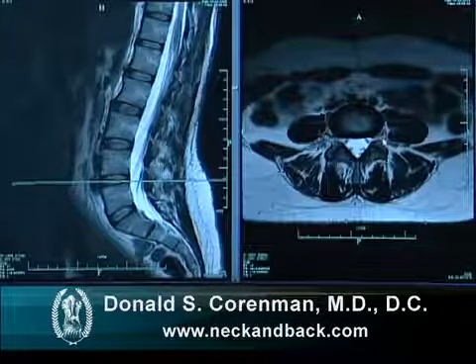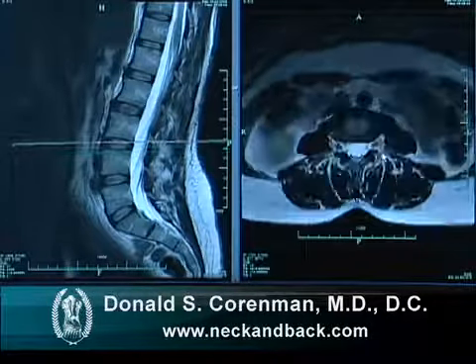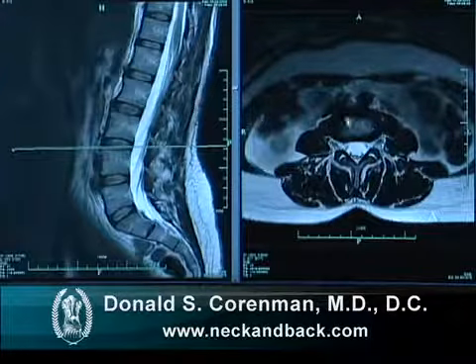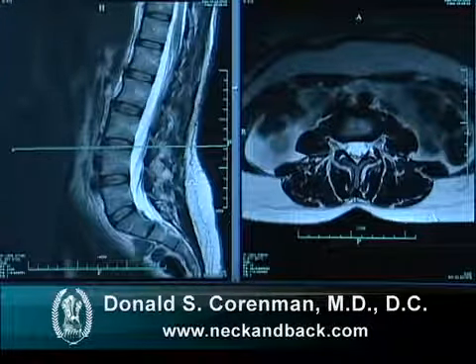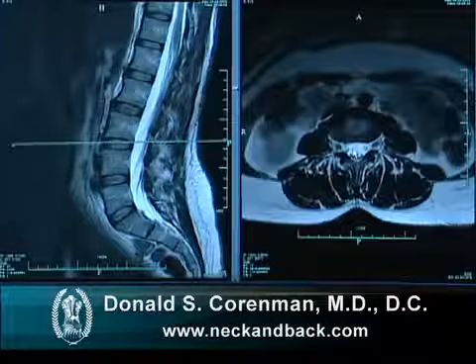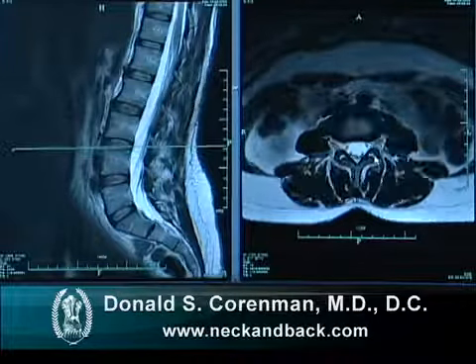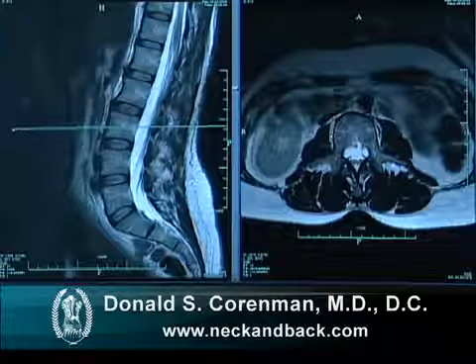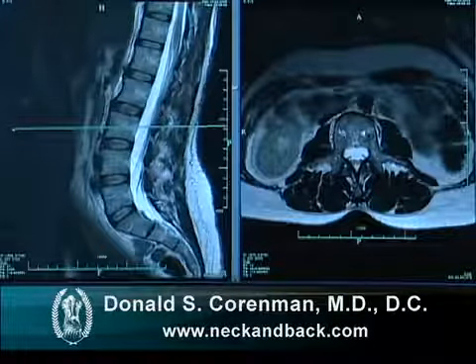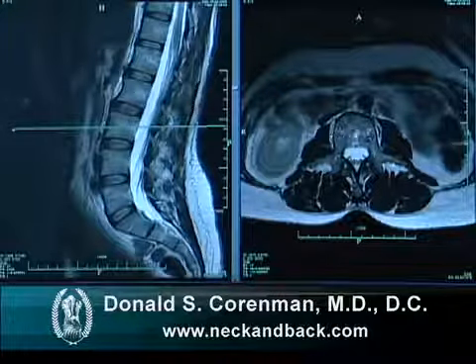These are normal facets. We can march up then and go to the next level at 3-4 and again see the same thing. The jelly-filled donut, the outer plies of the tire, the sac of nerves. If we get a little higher, we can see the actual facet joints, and this is a normal level. We can continue to go up and see more. Here is the basivertebral vein and some of the veins within the vertebral body itself. So when you look at these images, these are normal.